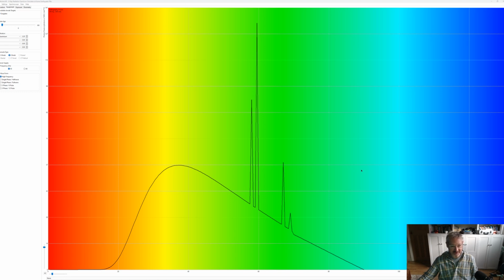I thought I'd just do a little video to show you what the answer really is, using TechnicVR from Shaderware. So basically we are all taught about these X-ray spectrum spikes, as you asked in the question, these characteristics.